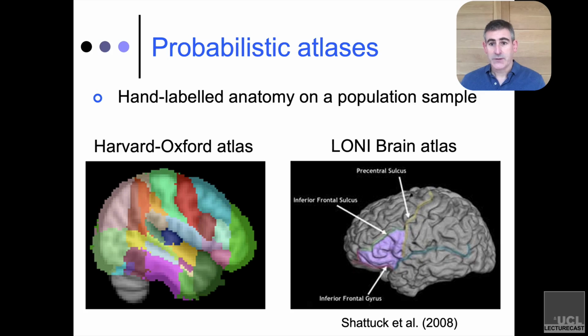As a result, if you put your crosshair on a particular voxel, you get a probability distribution that might say, for instance, this is 45% likely to be in pars opercularis, which is part of Broca's area. Maybe 30% likely to be in the inferior frontal sulcus, and whatever's left, which I guess is about 25%, maybe it's ventral dorsolateral prefrontal cortex across your population.